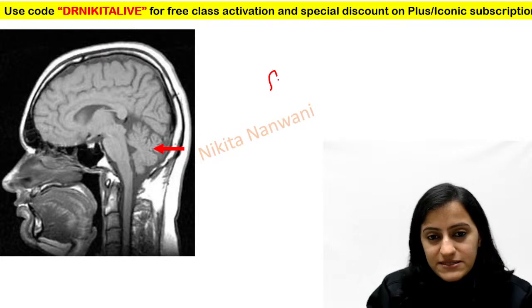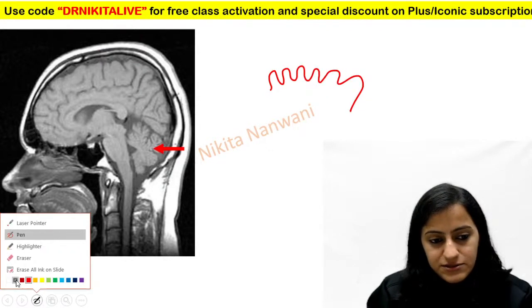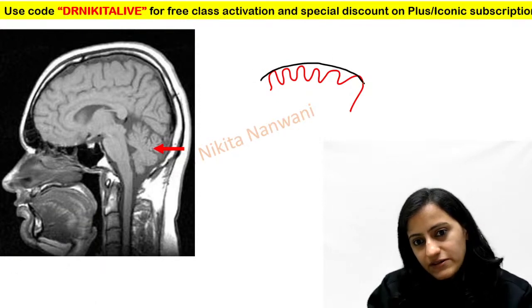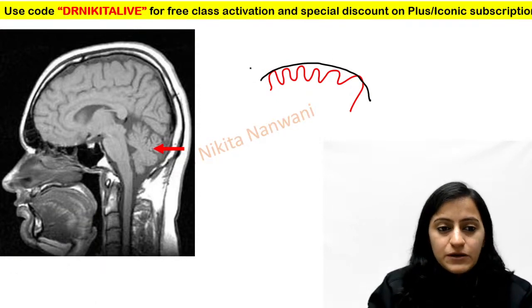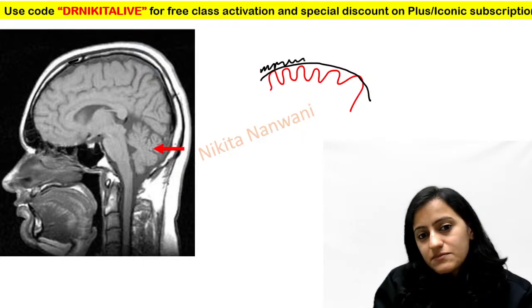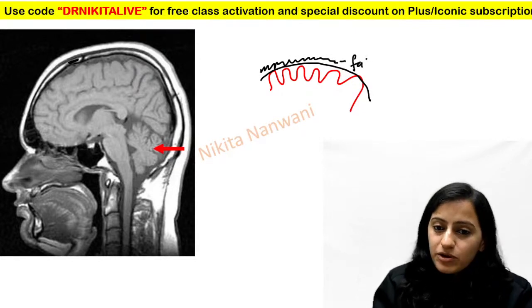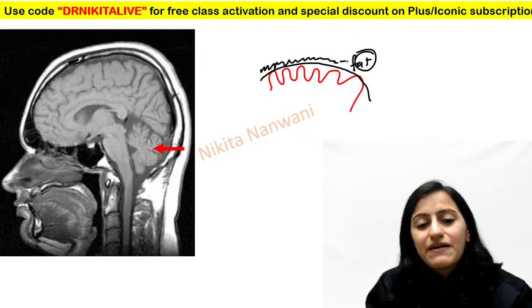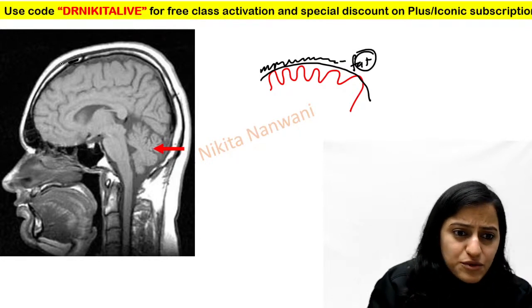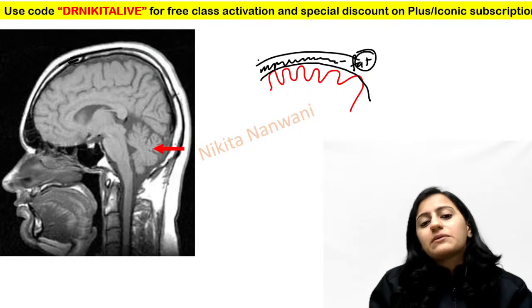So what you see basically is, if this is the brain parenchyma, the gyri and sulci that you see, just adjacent to that is where we have the inner table of the skull. After that, this white color which we see is the bone marrow, the diploic space. Why is it white? Because bone marrow contains fat. Fat is white on MR, T1 and T2. After that you will again see the black line, after that the white line. So that is the outer table of the skull.